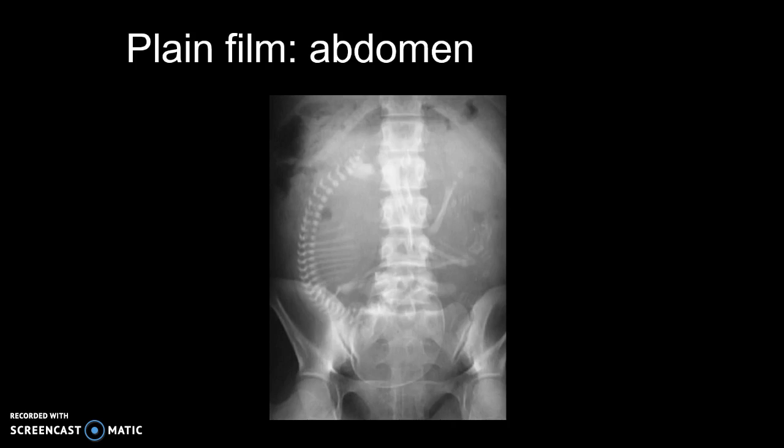Bone abnormalities are often seen on the KUB as incidental findings. Can you identify the lines on this popular image? This is a 23-year-old female with no significant past medical history who was complaining of abdominal pain and difficulty voiding. Surprise, you're pregnant.